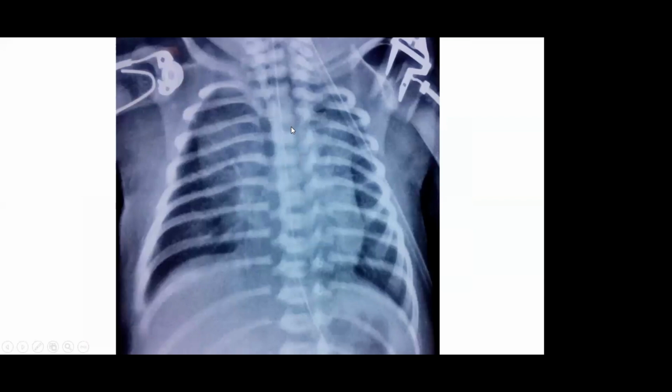See, this is a rotated X-ray. If you can see the area which is away from the plate, it will look darker to you. So this hemithorax looks darker to you. This hemithorax looks brighter to you because it is near the plate. Hence, the right side is more above. The thymus, which was supposed to hide behind the mediastinum or sort of merge with the mediastinum, is showing as a separate entity. So you might see some lump or some swelling or some mass in the right hemithorax. This is nothing but a rotated X-ray where the thymus is getting exposed, with the exposure it never used to get.